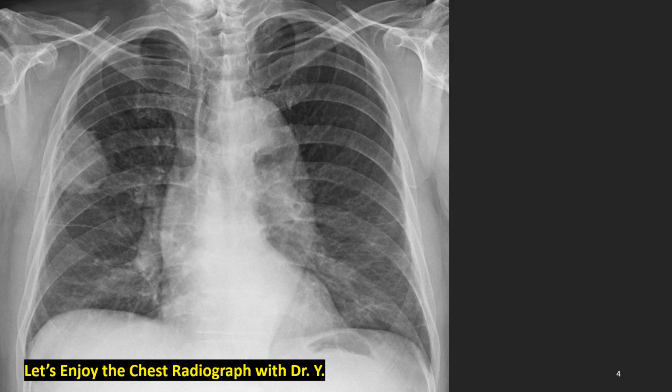This is the first case. How do you feel about this chest radiograph? Yes, so easy, very easy. Why is this film so easy to interpret? Let's contemplate about this.